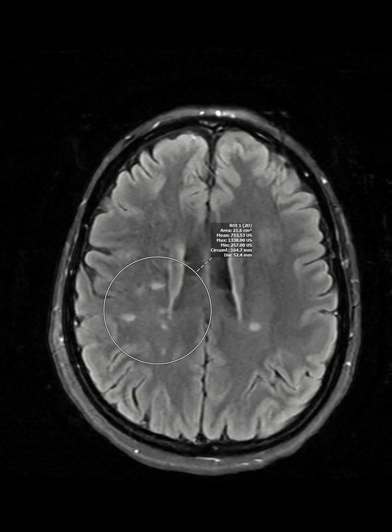There are also other differentials here. It can be a prior infectious or inflammatory process. It can be toxic or metabolic causes. It can be vasculitis, all other stuff. But it's really important to always think out of the box. As a radiologist, try to put together your clinical information and imaging features, and come up with a good diagnosis that fits everything. Okay, hope you guys enjoyed this session.